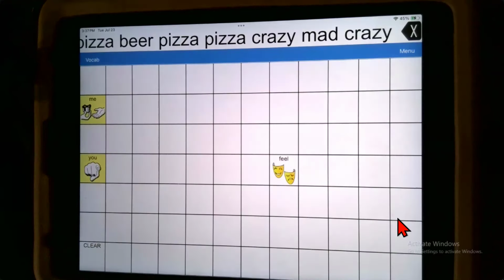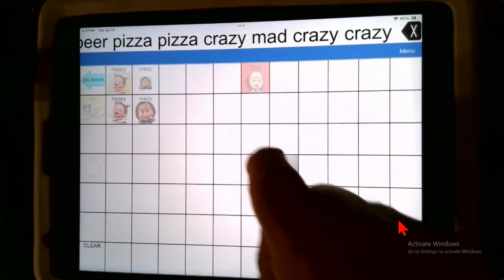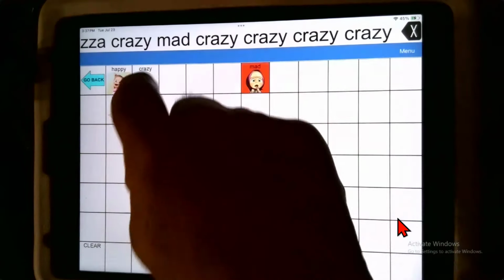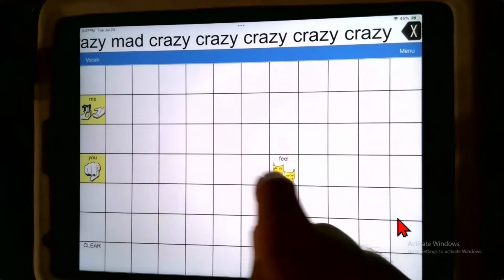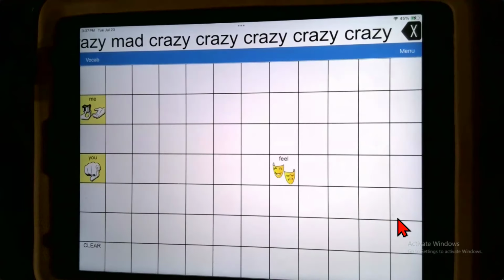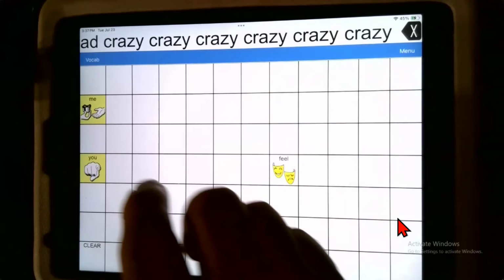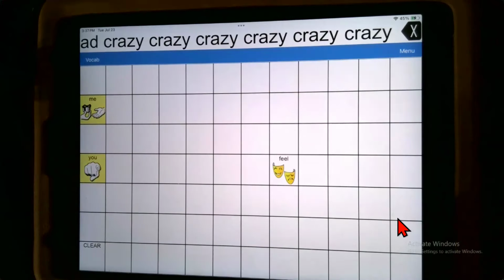Crazy. Might as well review that. If you learn that this button plus this button says crazy, that plus that says crazy, that plus that says crazy, that plus that says crazy. When I touch my finger and do that, your brain says crazy because that motor plan, because speech and gesture share a common neural structure. And when I say the word crazy, even though you don't know it, you're practicing that sequence. Crazy. So I can't have crazy in two locations. So just be really pure with me on that.